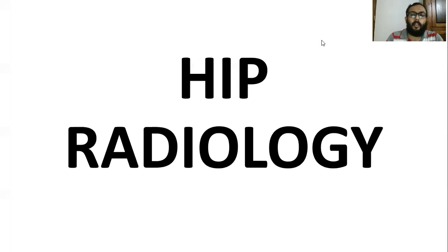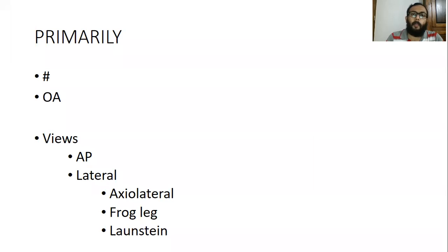Hi friends, in this video I would like to discuss the radiology of the hip. Radiology of the hip is most commonly indicated in fracture or acute injury setup of the hip, and in osteoarthritis or pathological conditions of the hip. The views mainly include the normal AP view.